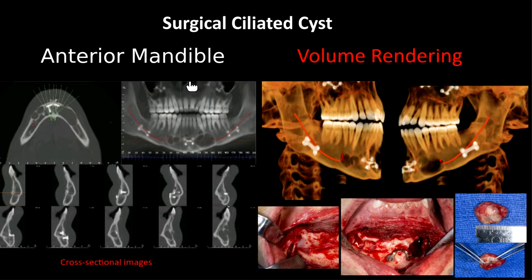And we made volume rendered images. We showed this to the patient and explained it to the patient, and then our colleagues did surgery, and we removed 17 of those from the mandible alone.